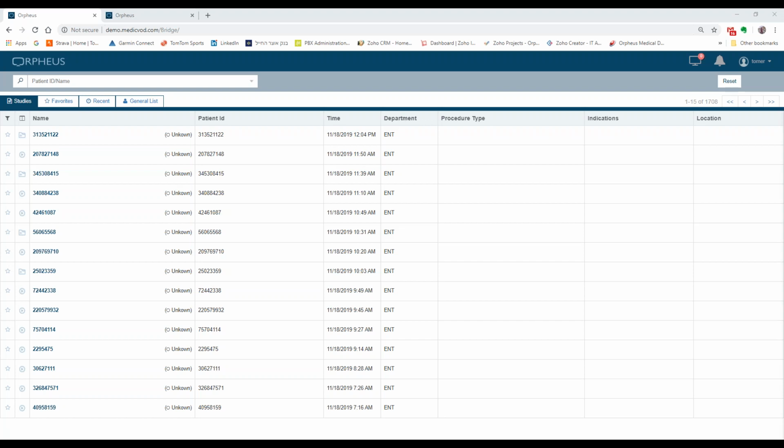Yeah, I think that's a good differentiation to make: things that are supposed to go on the patient record should be done on Lumens, things to be done for research purposes they could do here. And I'm good on my side, so I'll probably have more questions if tickets come in regarding this stuff, but right now it looks good.